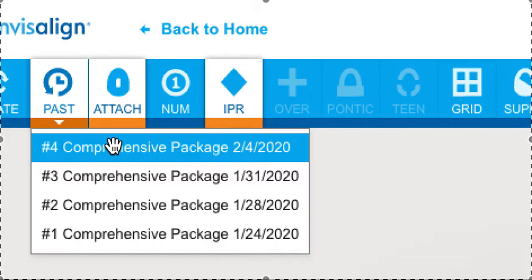The main thing we want to let them know is we don't want them to choose it based on the number of aligners, because first of all, I don't want you to have different prices anyways. I want you to have one price. And the number of aligners may change. This is completely subjective, right? So it depends on how compliant the patient is, how accurate your IPR is, so many different variables, the density of the bone. So they really shouldn't even be looking at that, and you're going to ask them not to look at it because that might change.